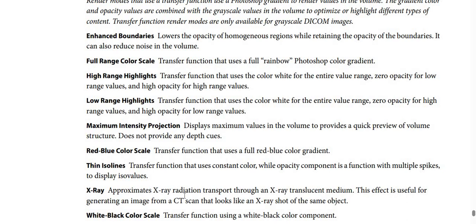The second option, full range color scale. It's a transfer function that uses a full rainbow Photoshop color gradient. And the third option, high range highlights.